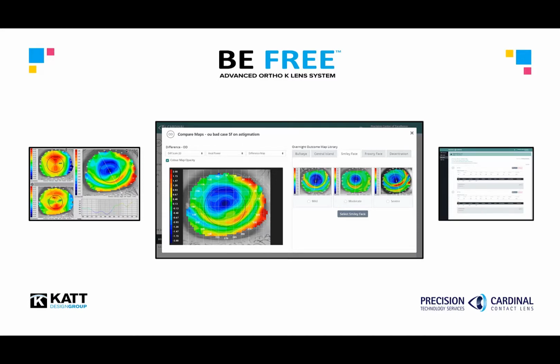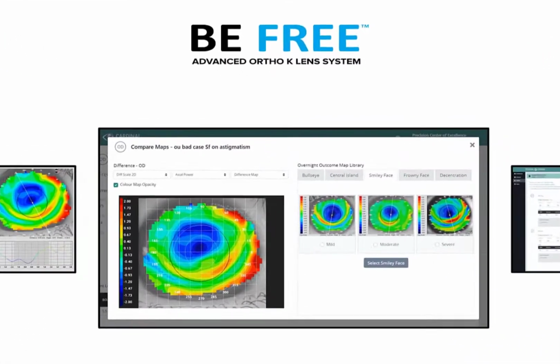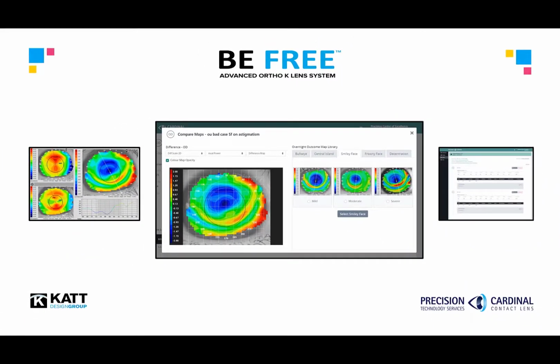For users with integrated topographers, you are able to upload your maps, compare them to the gallery of outcomes, choose the appropriate response, and have the software make the complex changes in an efficient and accurate manner. Additionally, by uploading the topographies and findings, you will also make it possible for the Precision and Cardinal consultation team to assist with processing. Whether you modify the outcome in the BeFree software or share the findings with your consultant, the BeFree platform makes the lens optimization process trouble-free and easy.